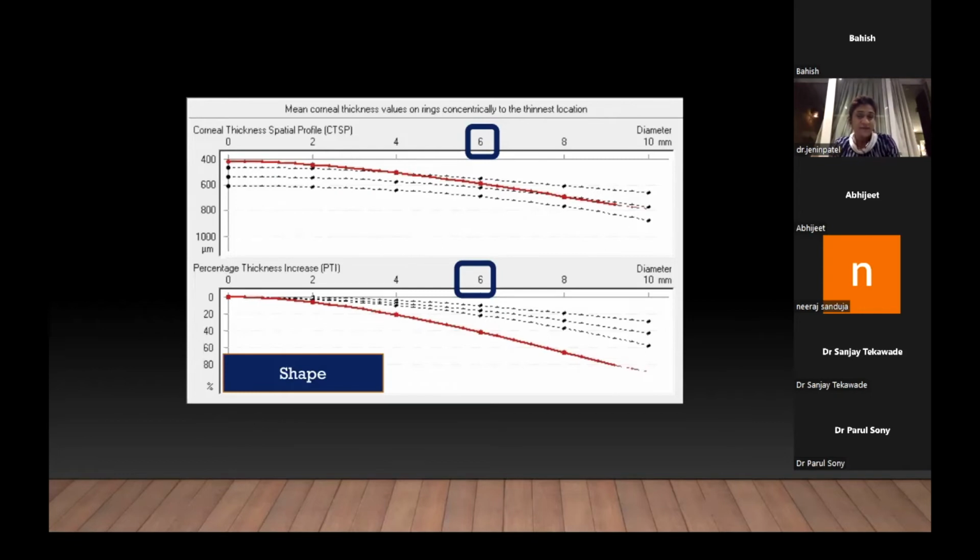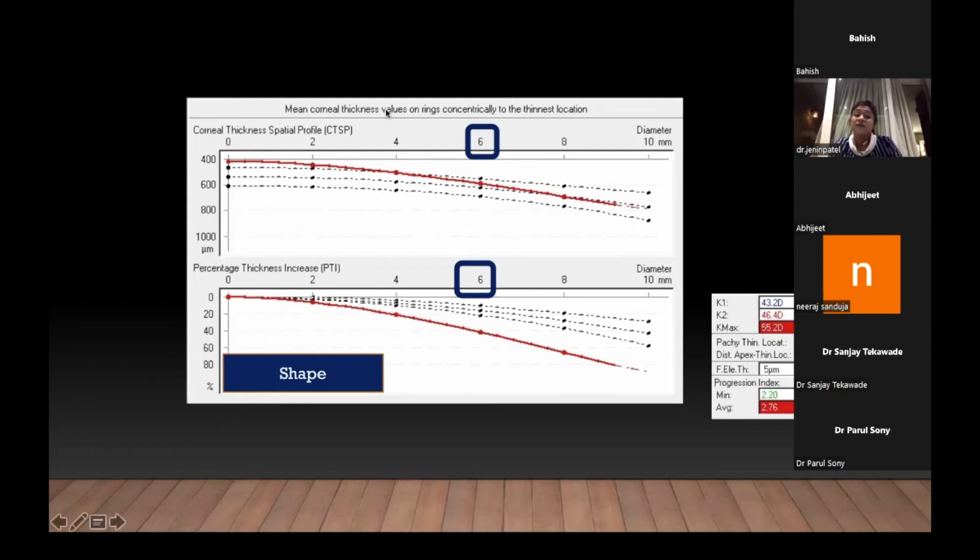Okay. Another very, very important parameter when you're looking at this is your average. Any average which is more than 1.1 is a red flag sign. So even if your graphs do follow the path, but your average is more than 1.1, you have to be cautious. That's the numerical value which you definitely want to remember.